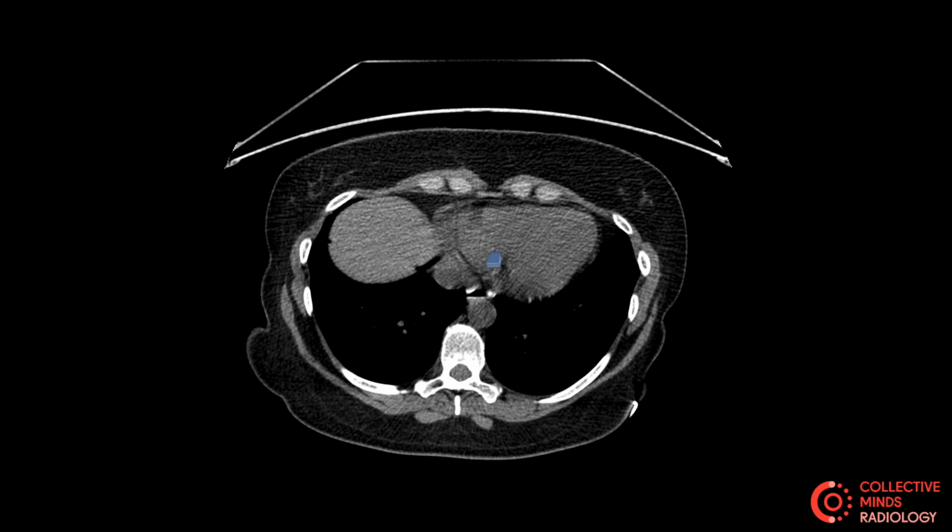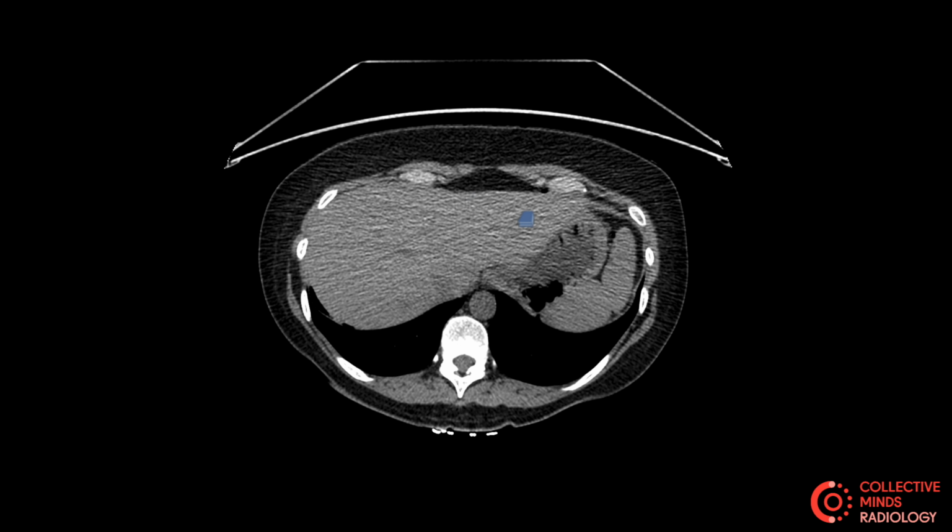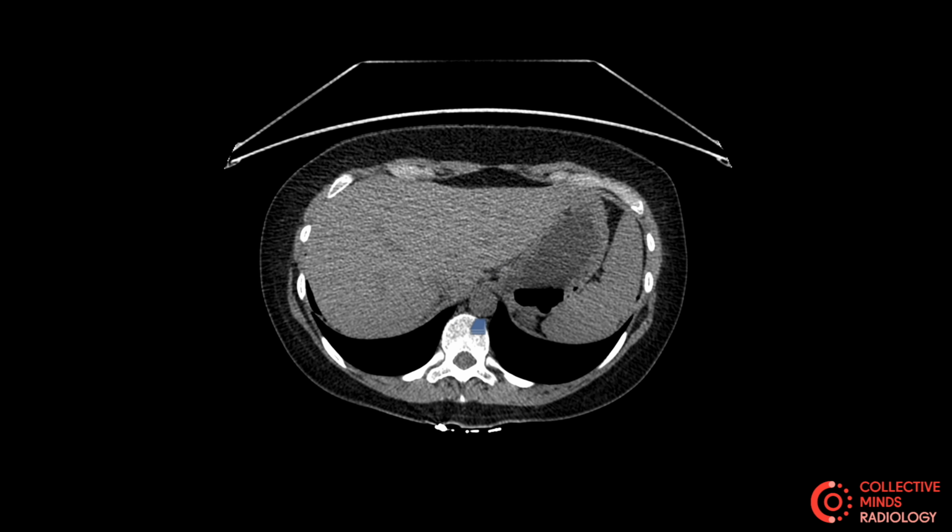In this particular situation, I think they've said that this patient's got left-sided abdominal pain. But before we start to really hone in on what the possibilities for the cause of pain may be, and yes, they may be calculi or a renal stone, we're going to go through some of the anatomy. So as we scroll further down, we can start to see that the liver is sitting right up here in the right upper abdomen. If you ever get confused as to which side is the right and which side is the left, try this little silly thing that I use, Ralph Lauren. When you write that Ralph Lauren, RL, therefore this is on the right and this is on the left. Okay, it's really silly, but that's just the way my mind works.